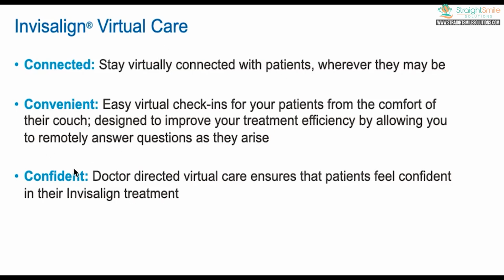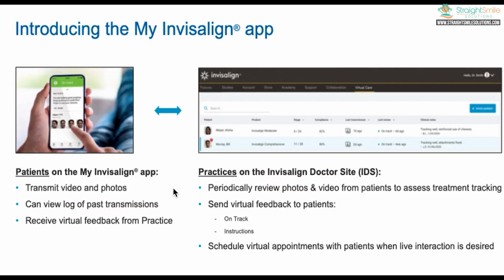It's just that this is HIPAA compliant, and this is what I like about it. It links straight into your Invisalign dashboard, which is great because the doctors will get a notification. You'll go into your Invisalign portal, log in, click on your patient, and you can see their tracking photos. So that's pretty sweet. And the patient can just check in on their phone, which is totally brilliant.